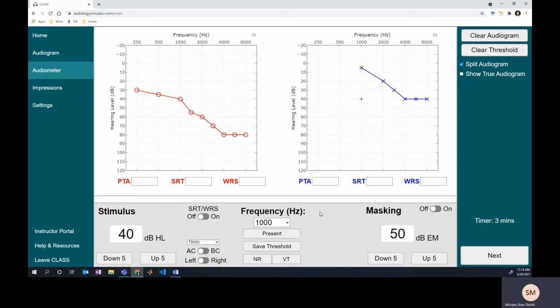So right away, I'm looking at this and I'm noticing some things. These two audiograms are mirroring each other pretty closely, in that there's this sloping in the right, but it's also sloping in the left at a much lower degree. So I'm thinking that this right ear might actually be loud enough that the sound is crossing over and actually being heard in the left ear. So we'll have to check our air conduction thresholds and see if we'll need to mask those, because I think the difference is just about right to need masking for air conduction thresholds.